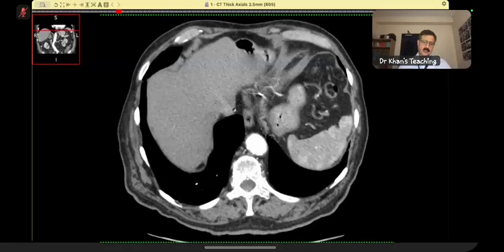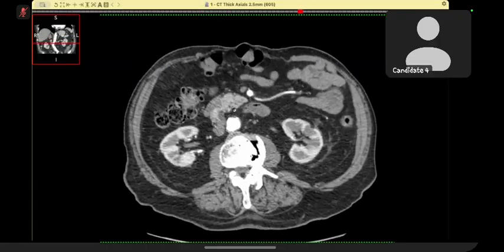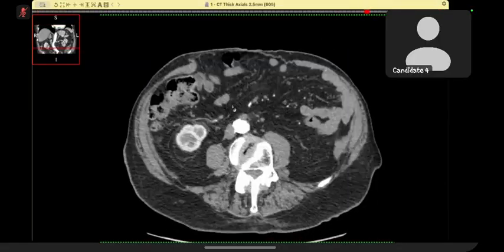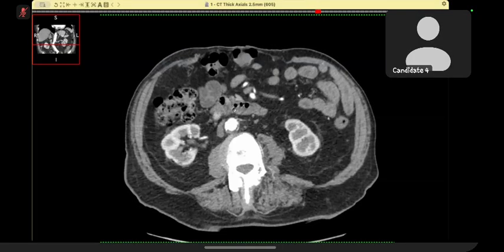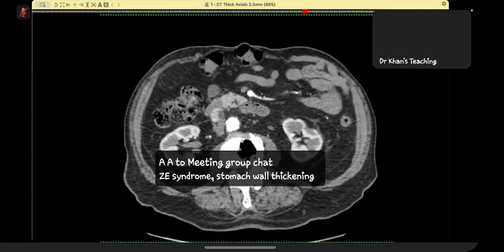which I couldn't appreciate. And what else? And any tumor in the mesentery, to see other associated neuroendocrine tumors. Final conclusion. So it's a neuroendocrine tumor close to the duodenum. Okay, sir. Thank you.